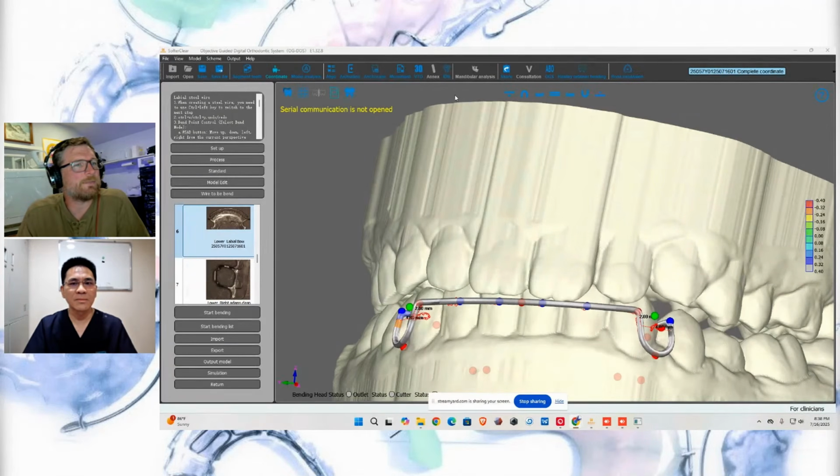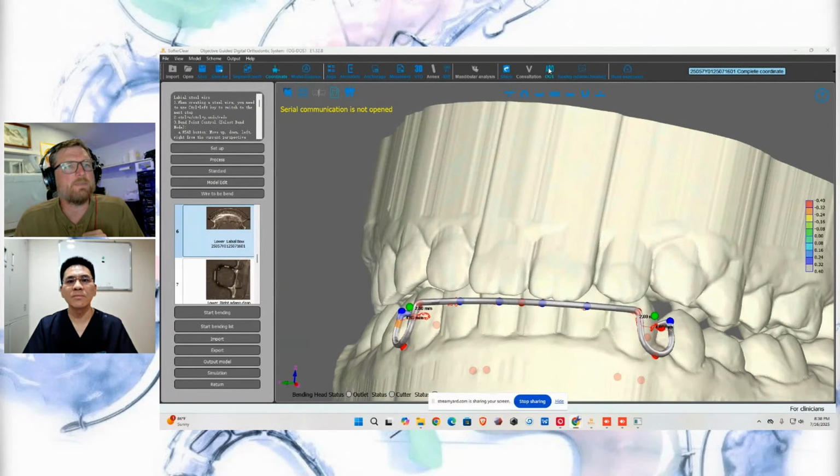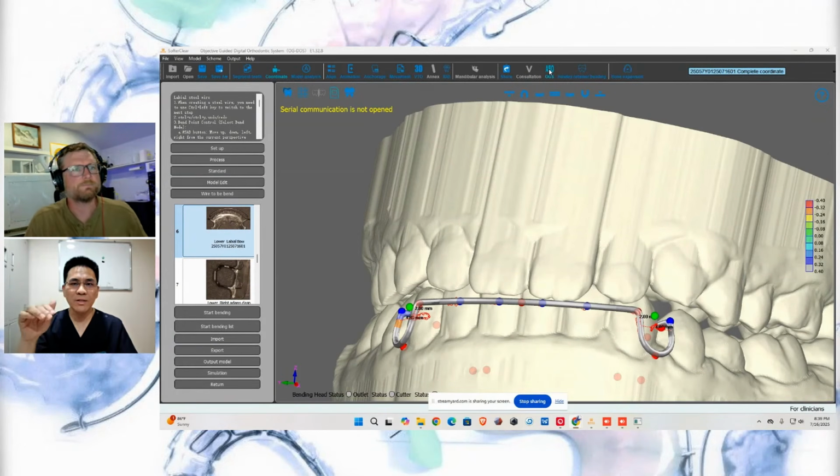So that's pretty amazing. And I see indirect bonding. Yes. Of course, here's the wire bending. And then anchorage implants, like temporary TADs. Okay. And then the ABO, is that just to make the models for a case submission? Yes, it's ABO models, the OGS.